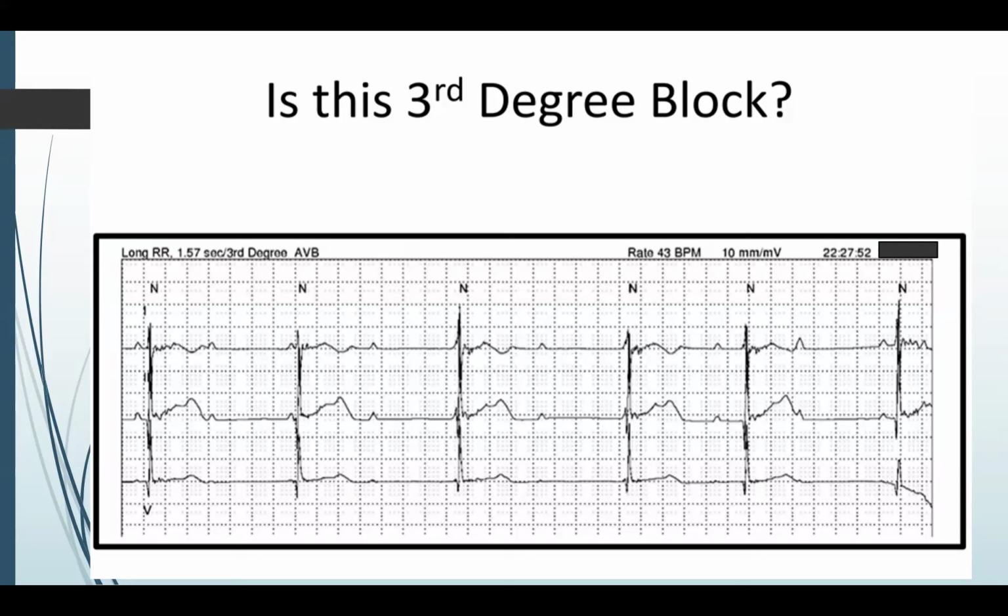So we have discussed in the past that when a patient has complete heart block, one of the clues or tells that it is complete is that you see a very regular R to R interval. It may vary by a few milliseconds, and certainly over long periods of time, people in heart block can have variability of their ventricular escape rate. But the point is, just as you said, if that were the case in a single strip like this, which is 6 seconds, we would expect the R to R would be fairly stable throughout this tracing, but it is not.